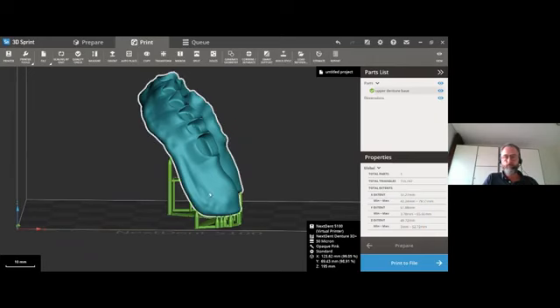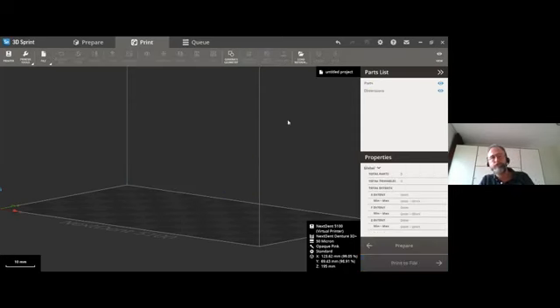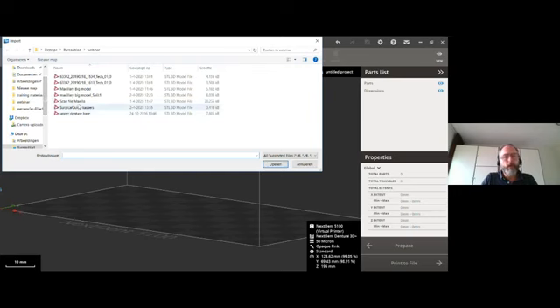I received one question over the Facebook post, and that has to do with the position and orientation of the models when we import them. They are at the 0 point or not inside the platform. Maybe you can comment on that a little bit. Why is that, and is this something that will change in the future? Good question. Let me take the model that we've used.